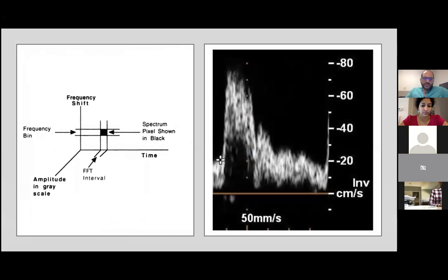So when we look at ultrasound, the most important thing that we're doing is actually not visualizing the stenosis itself. A lot of times it's obscured, it's difficult to see the renal artery. So what we're actually doing is inferring, based off of the spectral Doppler signal, whether or not a stenosis exists. And so understanding what a spectral Doppler is, is very important.